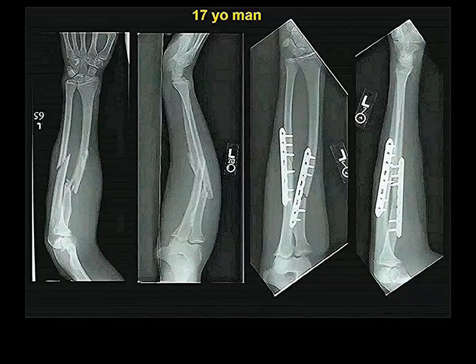Obviously, a fracture of the ulna and a fracture of the radius. This is how these things are repaired in modern orthopedics. Put a plate with screws and you bring the two opposing ends of the fractured bones as close together to one another as you can in alignment.